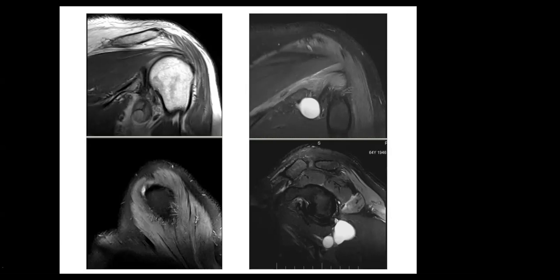Yes. So remember, this is a routine MRI. This is not MRI arthrography. The next step is MR arthrography. MRI arthrography is the gold standard for labral tear. So we make a recommendation before surgery. We always make a recommendation for MRI arthrography before surgery, because the tear could be a small tear or could be a big tear. That will change the surgical management for the orthopedic surgeons. So they need MRI arthrography to see how big the tear is before they go in arthroscopically to repair it.